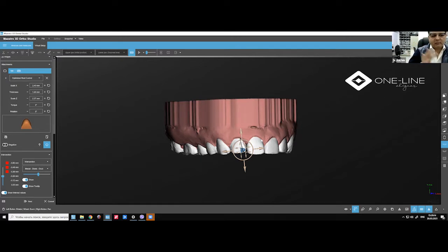So right now we are talking about rotation. For rotation, you can use optimized root control. I like these very much. I can use ellipsoid, and we can use the first attachments. Okay, so let's see if there are any others which are good enough. The square attachment is good enough. It doesn't really look good in the mouth, so I don't really use it.